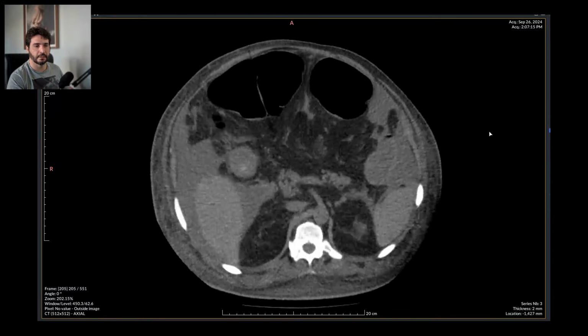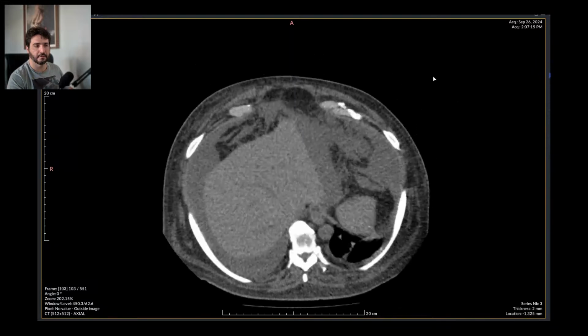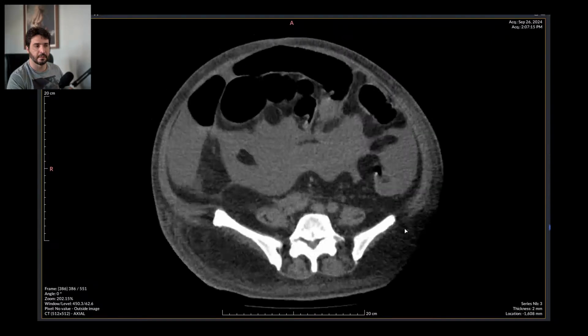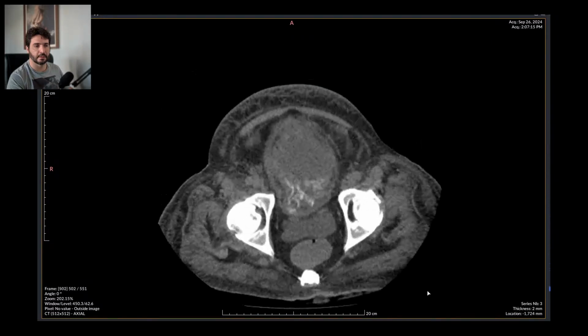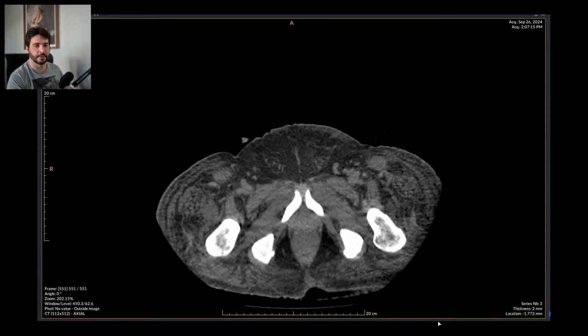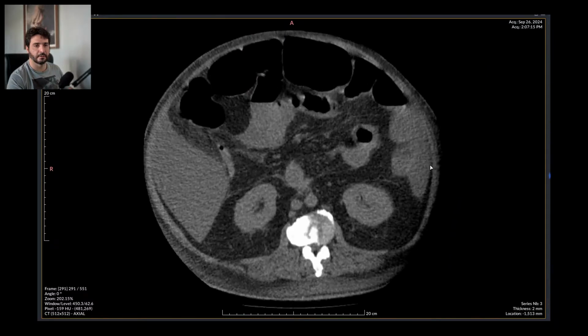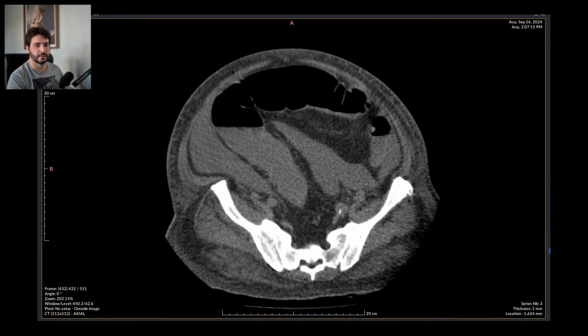And this is it. Kidneys are fine. Spleen, as much as we can see. And the liver is just not sick enough to be of importance. Diffuse edema. Also, the field of view is wrong. It's too small. Patient is too shaky.